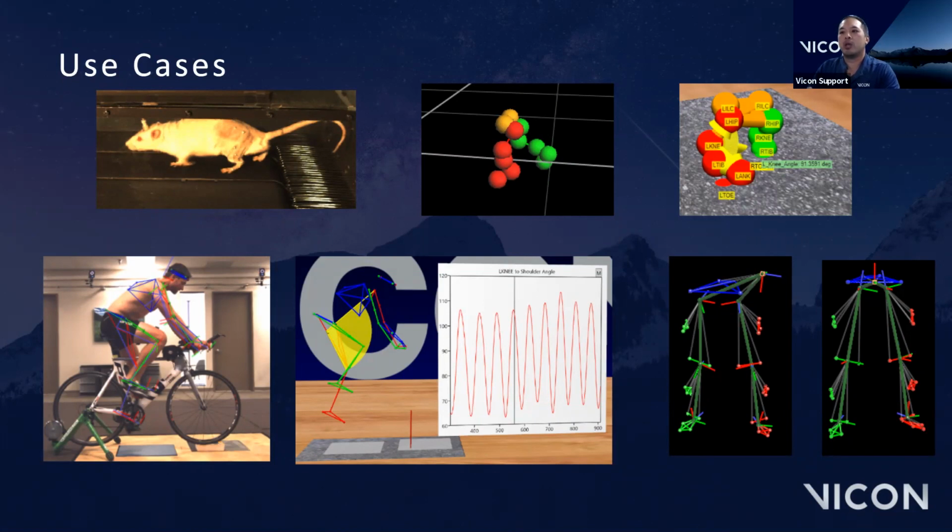This is how we can create segments using the right-hand rule. This is how Euler angles kind of work. And because it is wizard-based, as you'll see, we'll be able to switch the direction of our vectors, our definition of our segments, et cetera, very easily. So hopefully you can see the value in it being a teaching tool as well.